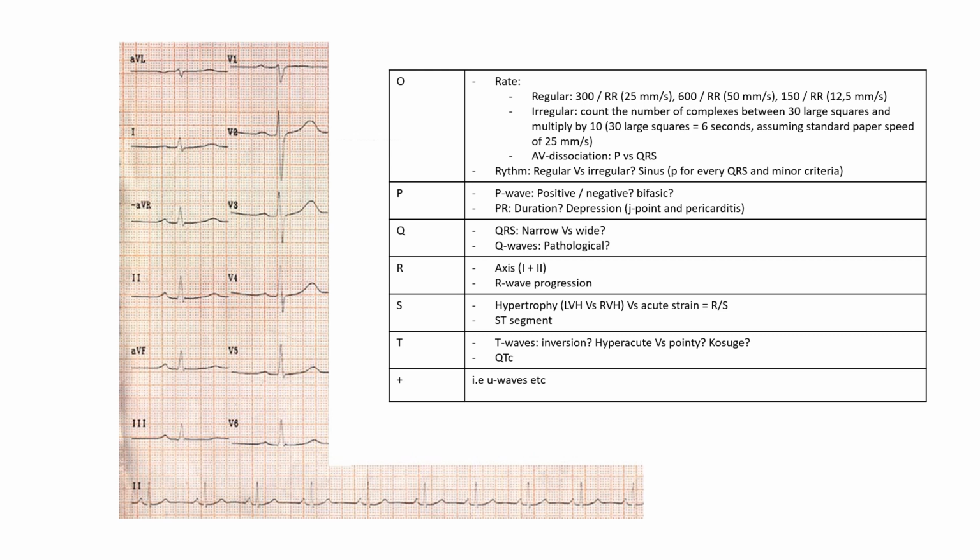All right. Then we move on to the ST segments. We can never interpret an ECG in isolation, right? We should always think of the context and a pretest probability. So what I'm doing here is sacrilegious. When the nurse comes to you, you always want to know what the patient's symptom is. Is it loss of consciousness? Is it chest pain? Is it ongoing chest pain? Is it ingestion of toxic drugs or so on? But here we're going blindly. This may be just a screening ECG because it really looks normal.